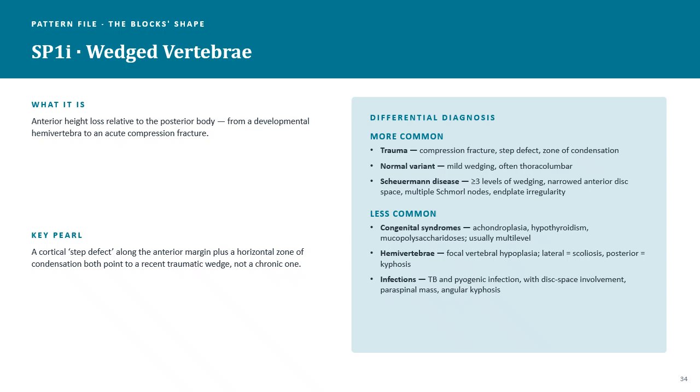There are also some congenital abnormalities that can cause this wedge shape, meaning the person was born with it. Hemivertebrae is one of the conditions. It occurs when part of that vertebrae doesn't fully develop, and that can contribute to what we consider an abnormal spinal curvature as well. So a wedge basically just means the front side is shorter than the back side.